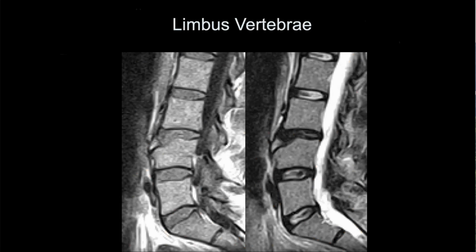These are thought to be due to lack of fusion of the circumferential growth plate there, and are considered, quote, normal variants. I'm not as confident that these are actually normal variants and that these may actually be old fractures, but they tend to be stable and they tend not to be associated with definite symptoms and are not surgical lesions.